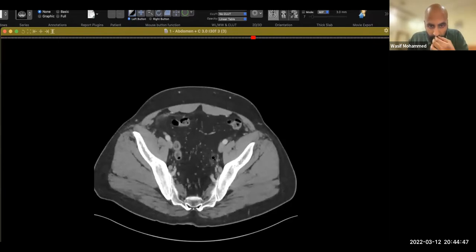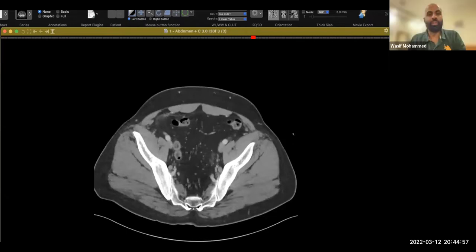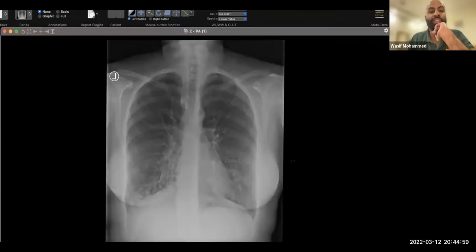So generally in the exam for Kartagener cases, they show you a flipped image. Yeah, this is how they would show you in the exam. But I decided to be nice. In retrospect, I think you are more than capable of diagnosing it even with a flipped image. So that's the importance of just looking at the image markup, right?